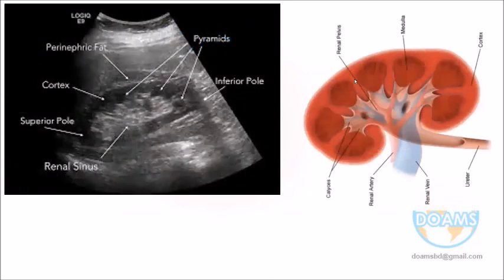I will show you just a few minutes with the ultrasound, doctor, and after that I will talk something more also. Just be with me. This is the ultrasound. Every day, in your practice, possibly you are seeing this ultrasound picture and we are reluctant, looking only at the report. But to be more confident, try to understand common ultrasound of the KUB region, kidney.